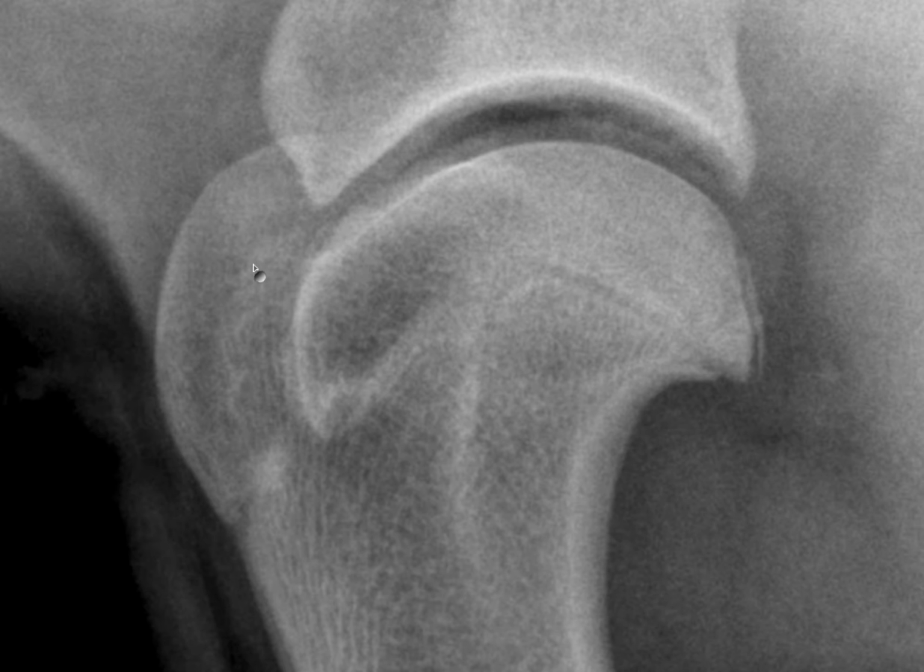Something that is very subtle, if you look, this part of the bicipital groove is slightly sclerotic. It looks slightly more opaque than we would expect. And what this is likely is some degree of osteophyte formation. Now, whenever you have degenerative joint disease in the shoulder, this is one of those areas where the osteophytes will start to develop. Now, this does not necessarily mean that there is primary disease of the biceps tendon. You will see this as a reaction to pretty much any other chronic intra-articular disease process.